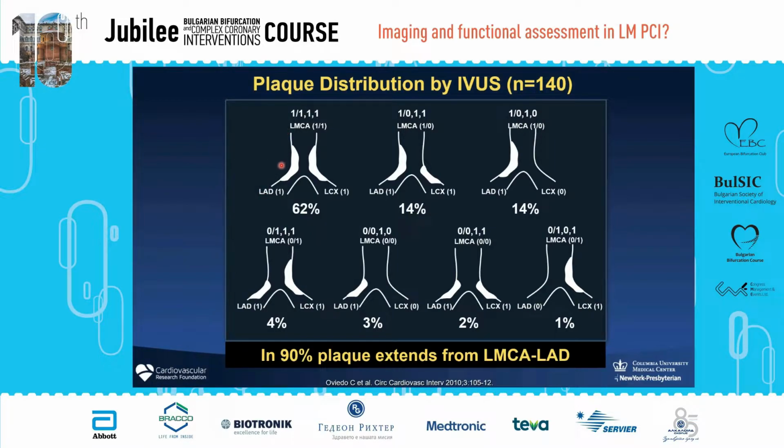However, what is important is the distribution of plaque in the circumflex, having a lot of variation, meaning sometimes very diffuse and sometimes isolated or sometimes nothing, no matter how it looks on angiographic appearance. Because most of the time you are going to put the stent from the LAD to the left main, those are okay already, but understanding how the circumflex ostium looks is quite important.